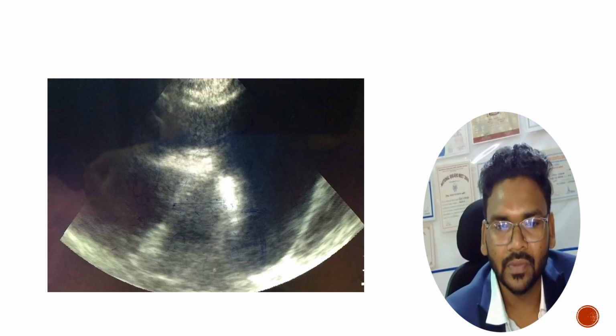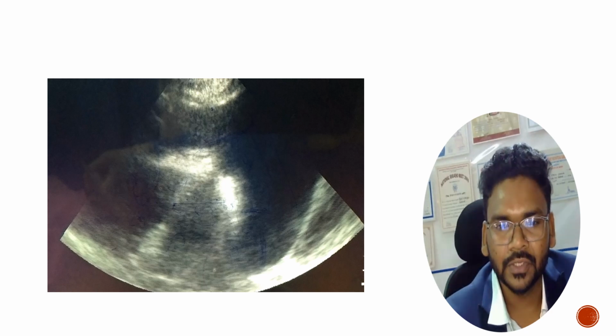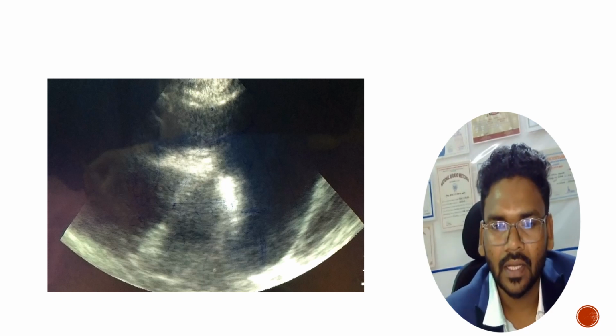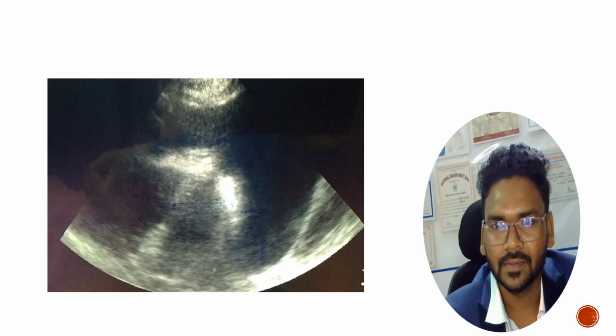And sometimes you will get false positive and false negative pericardial effusion. In pleural effusion and anterior fat pad, you will get a false positive, and in loculated pericardial effusion, you will get a false negative.